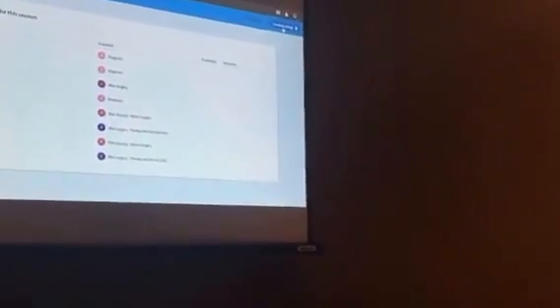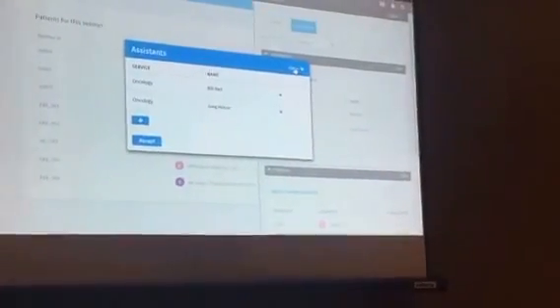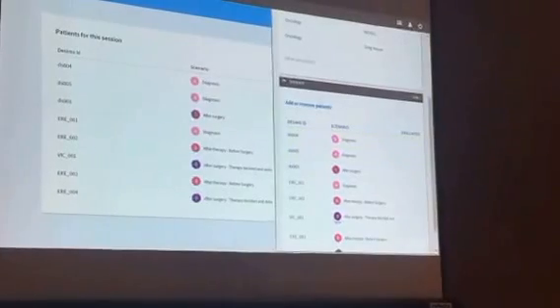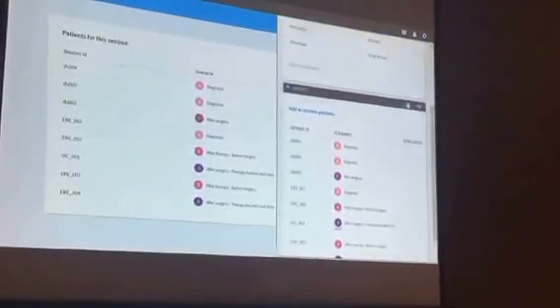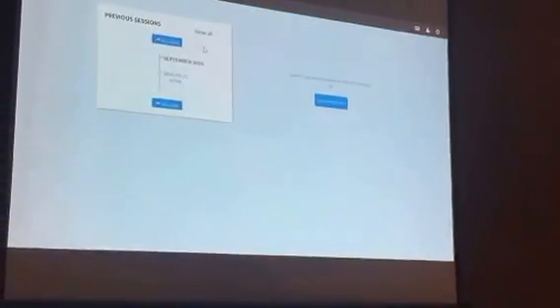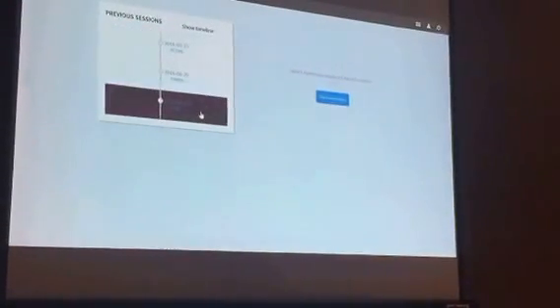If we go to the session setup, we could include different assistants that will be in the breast unit. We can edit the session and add or remove other assistants that will be there. We will also have a list of patients that we can include for the breast unit session. I will not go into the details here. We close this, and I would like to show you the evolution of, for example, one patient.